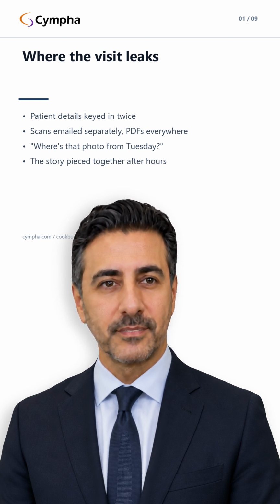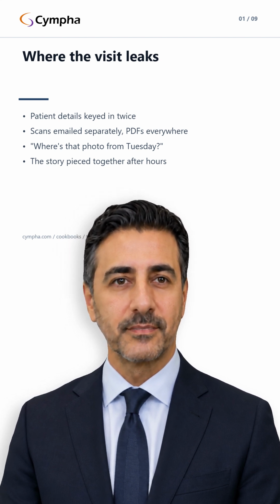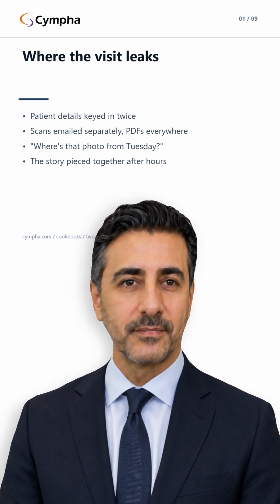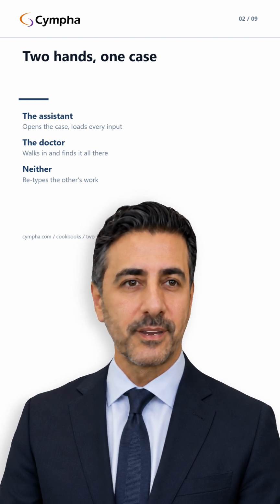Think about where a case actually loses time. Not the dentistry, the plumbing around it. The same patient details keyed in twice. Scan sent and one more email. A photo nobody can find. And at the end of the day, someone reconstructing what happened from memory. None of that is care. All of it is friction, and it lives in the handoff between your two pairs of hands.